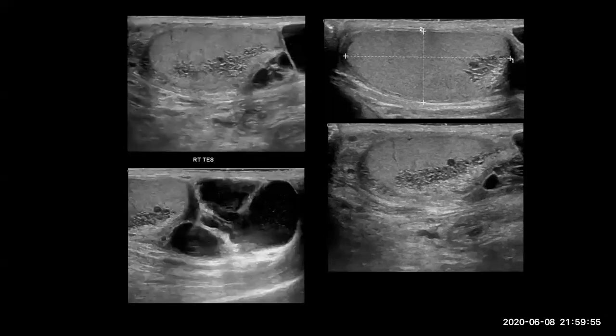Small cysts and tubular anechoic structures. Okay, very good. There is no mass effect. Okay, very good. And we must also see the vascularity on Doppler, also lack of internal vascularity. Okay, very good, avascular.